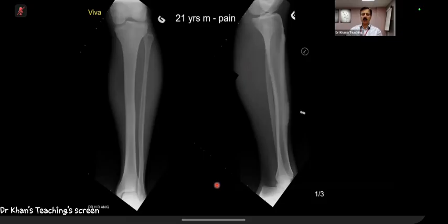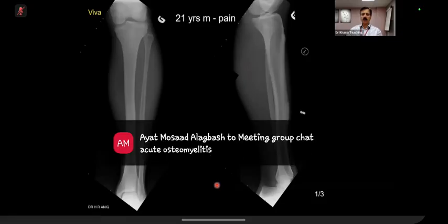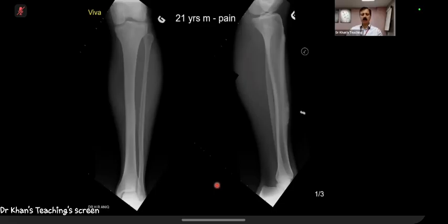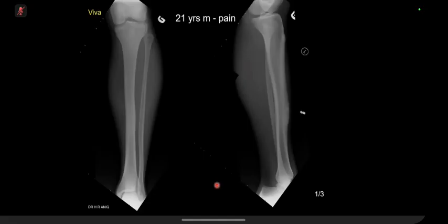This is my question. Would you consider further imaging with a CT? And how will CT help you? So if it is an osteoblastoma, then it should show you whether there's possibly a nidus within that sclerotic area. Okay, very good.